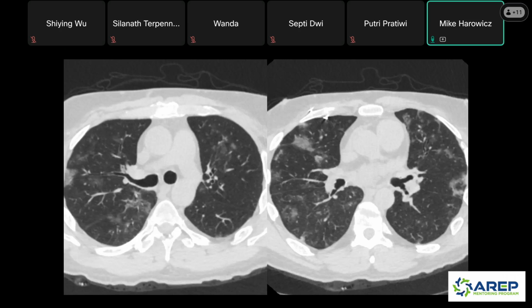So think about the secondary pulmonary lobule, right? It's the most basic anatomic unit of the lung. At the center, you have your bronchus and your pulmonary artery. At your periphery, you have the walls with the veins and the lymphatics, right? And so these opacities, you could sort of imagine that they're going around a lobule, right? Now, realistically, what's happening in these patients with organizing pneumonia? It's not that it's sparing a particular lobule, it's just that it has that look, we call it an arcade look as well, that it's going around lobules.